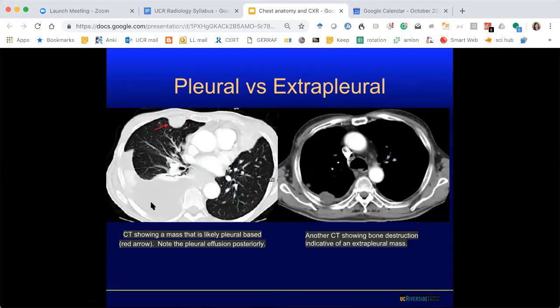Yeah, we have an effusion. So we have pleural effusion. We call fluid in the abdomen ascites, and then fluid in the pleural space effusion. And we think it's malignant. Why do you think it's malignant? You're correct. But why do you think this is a malignant effusion?